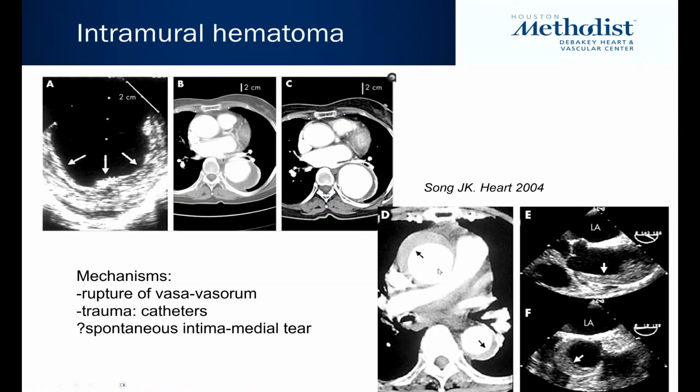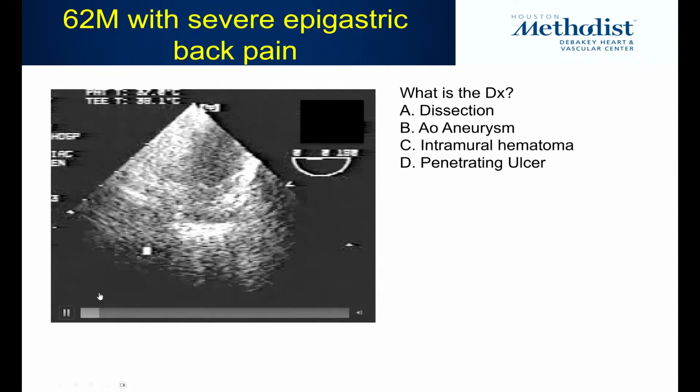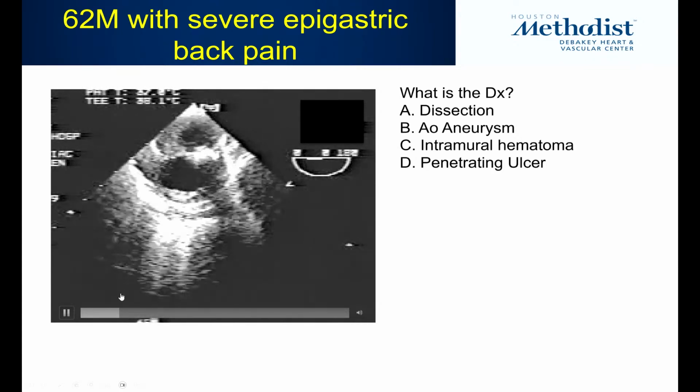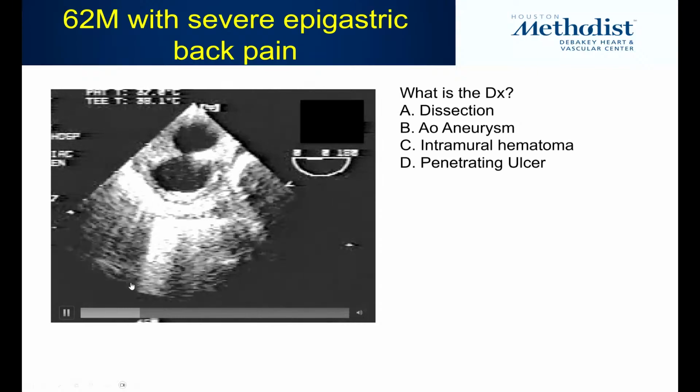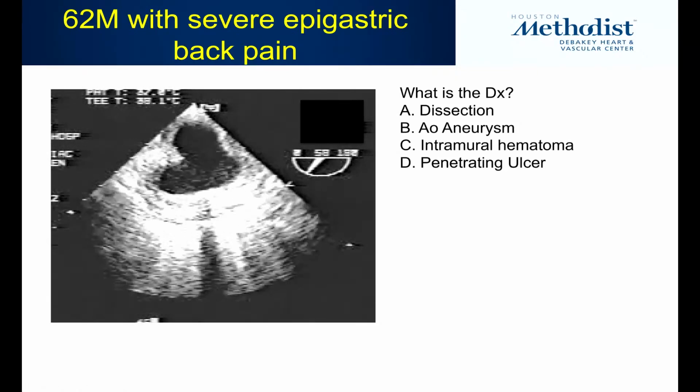You already saw beautiful cases of intramural hematomas and what they're caused by. This is the ultrasound imaging. This is the crescent-like appearance by both ultrasound as well as CT or CMR. And this is what by ultrasound you see with a penetrating ulcer.